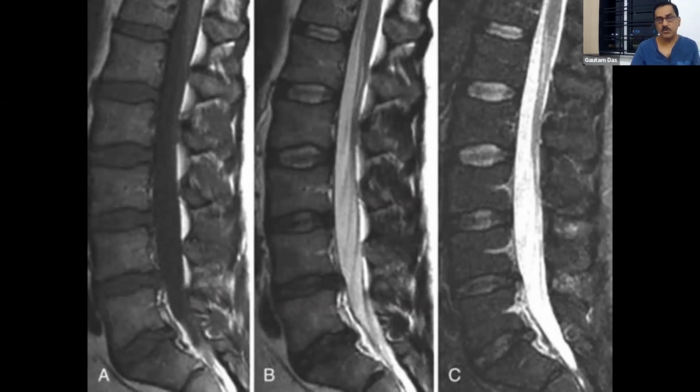Why? Because the disc when we are younger has a lot of water, and as we are growing older, that is called the aging of the disc. So what is called the aging of the disc? The disc hydration will be less and less and less. So the spine will not be flexible. If the disc has a lot of water, the spine will be more flexible. So when we are going older, the disc hydration will be less. So we can say that this MRI is most likely of a younger person than the other one, where the disc was looking more black than this one.